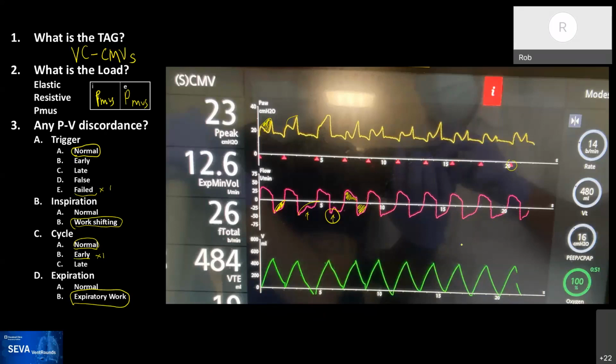I have a question. Yeah, go ahead. So one comment is that it's nice to see the square root sign and the differential being, this is not a leak, but an active exhalation before the inhalation before the exhalation finishes. Yeah, good catch. The other thing is, when the volume goes negative, I don't know how to interpret that.